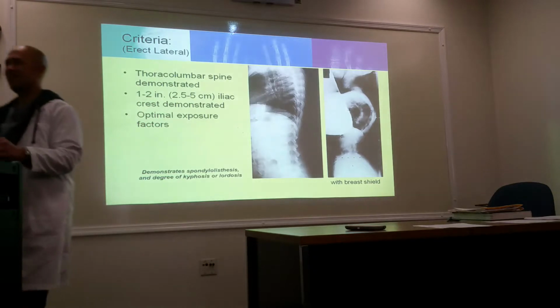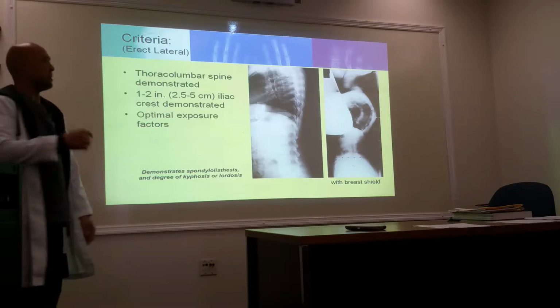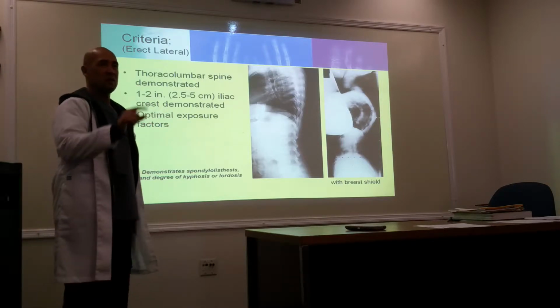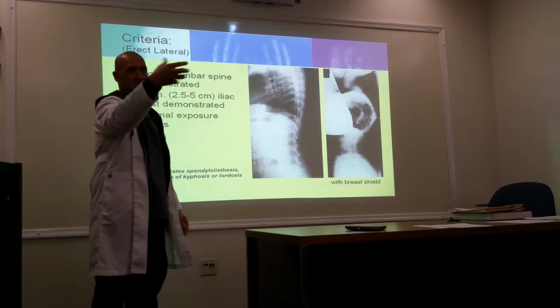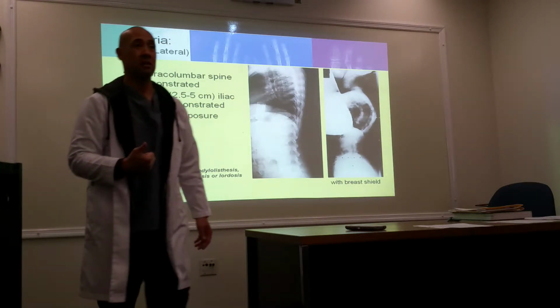That's grandma right there. So why is it called a scoliosis series? It's called scoliosis series only because when you have scoliosis, it's not only going to be a side curve, but there's going to be a rotational curve too. So they're trying to see the degree of rotation of the spine.